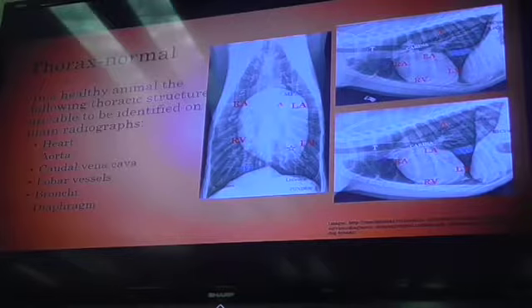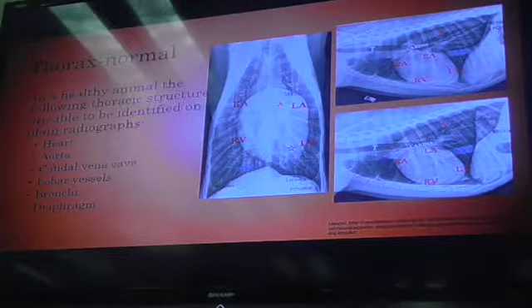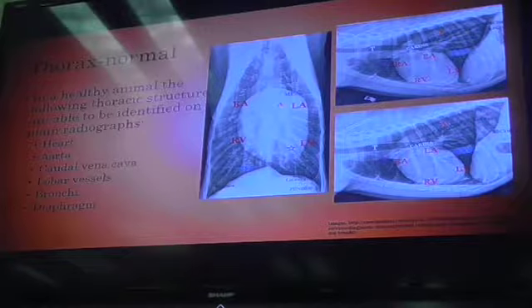We know that the heart typically sits center, okay? But if we see that the heart is now more dorsal, why? Okay, so you guys talked about some things with Dr. Vasudeva, like fluid pushing the cardiac a little bit up, pneumothorax, all right? So we look at these fixed landmarks, and we use those to help us identify locations based off of what we know, right?